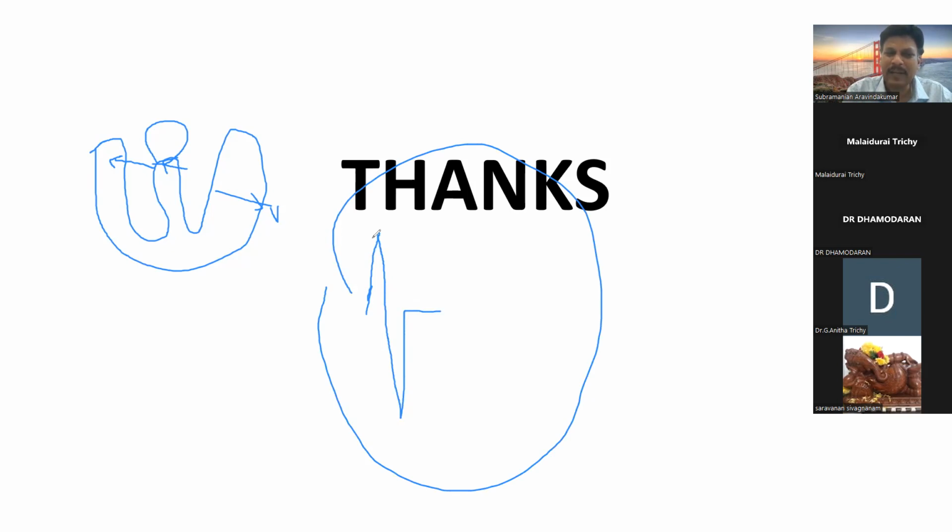It will be a completely tall R wave and a deep S wave. This is the classic ECG of VSD with reversal, Eisenmenger, biventricular hypertrophy, where you have a non-restrictive VSD.